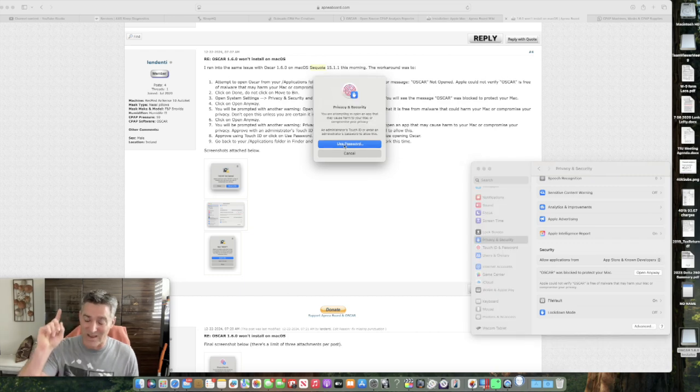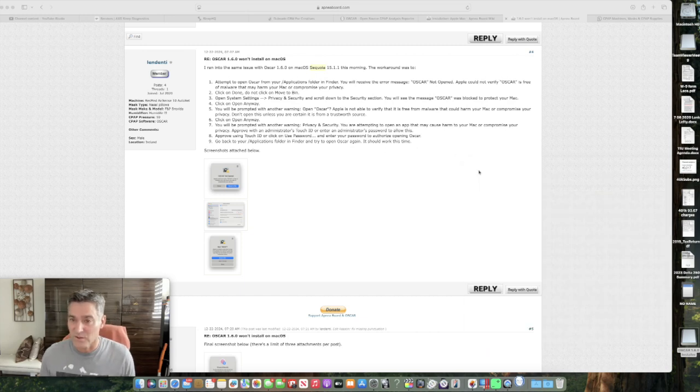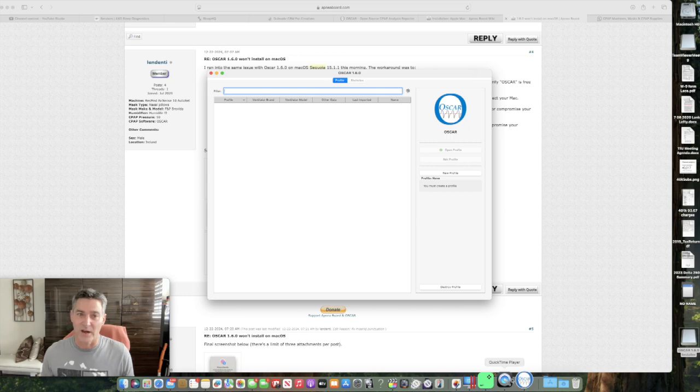Now I'm going to use my finger as my password. Bing. So that should have allowed it. Go ahead and close that guy. Oscar looks like it's trying to open, and voila, it opened up.